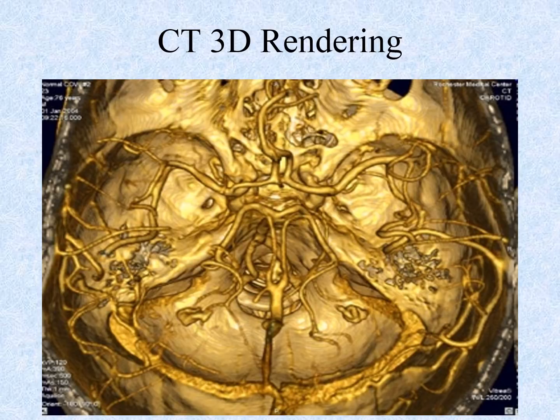There are other 3D reconstructions that are appreciated here using CT rendering and post-processing, and you can see the large middle cerebral artery traveling off, the anterior cerebral artery, as well as brain structures that they might be involved in feeding.